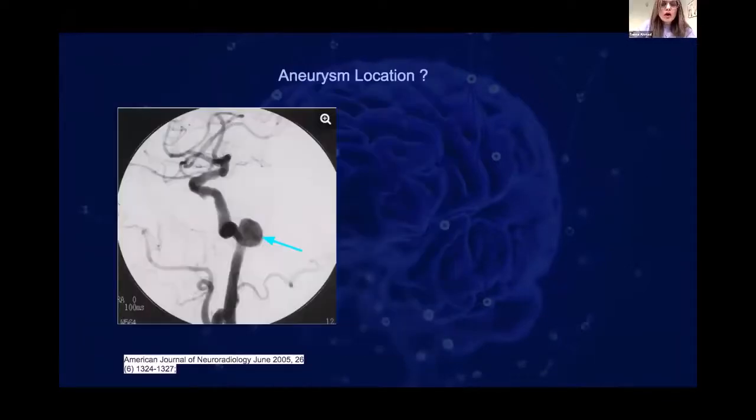I will not spend more time on the Petrous segment aneurysm because, as I told you, these are very rare kinds of aneurysms. This is a very old picture I obtained from an article in the AJNR, and you can see that this is arising from the anterior segment of the Petrous part of the ICA, and it is projecting posterolaterally, so it must be a pseudoaneurysm or maybe a saccular aneurysm. I don't know the history of the patient, but if any aneurysm arises here, the first thing we should think about is that it must be post-traumatic or a pseudoaneurysm.